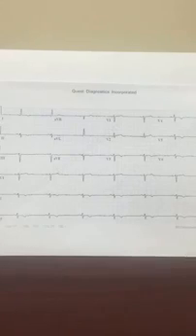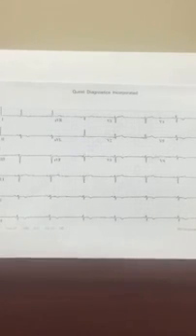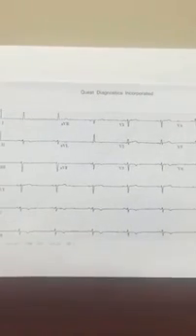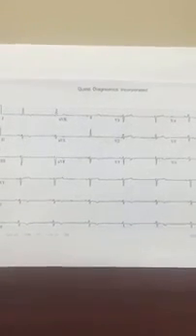Okay, so now we're going to talk about adult bradycardia with a pulse. Once again, this patient is going to present much more stable than the past patient we talked about with pulseless VT or VFib. So first you want to make sure that the patient is bradycardic. For example, we'll get an EKG, and in this case, this is an example of a patient with bradycardia.